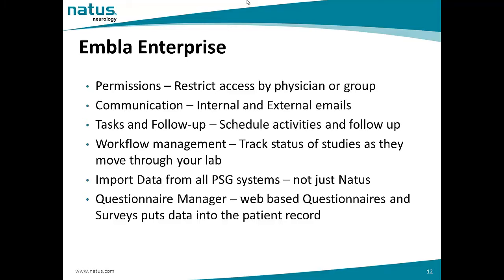In Enterprise, we also have internal communication, where you can send email-like messages internally. So when the person logs in to Enterprise, they will receive the messages. We can also assign tasks and follow-ups for a certain group of patients and tag them to the specific person that we want to follow up or do the task.